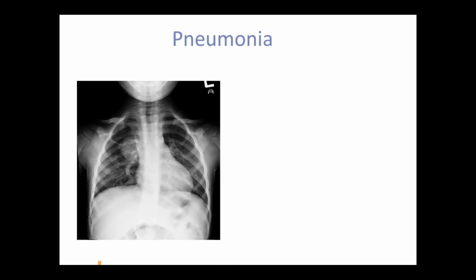Now, let's take a look at the lungs. The pulmonary vessels are clearly demarcated and tapered gradually, but you notice an area of hypolucency in the right upper lung field. There are no associated signs of pneumothorax or appreciable pleural effusion. Now, let's take a closer look at our area of hypolucency. The opacity is well circumscribed with no central cavity. What is your working diagnosis here?